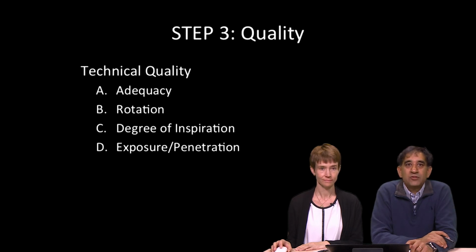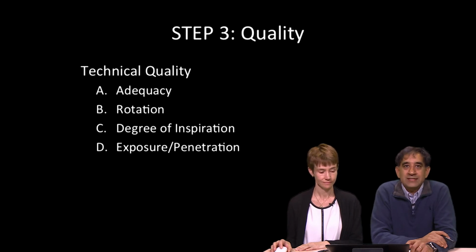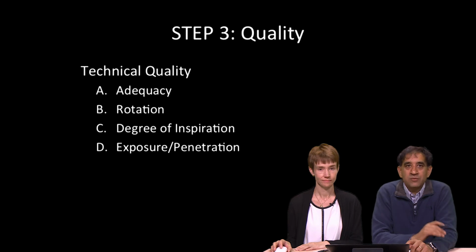And then the next step is going to be to address the technical quality of the X-ray. How good is the X-ray in terms of adequacy, rotation, degree of inspiration, and then exposure or penetration. So let's look at those elements.